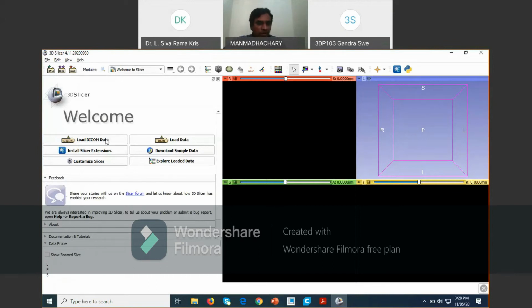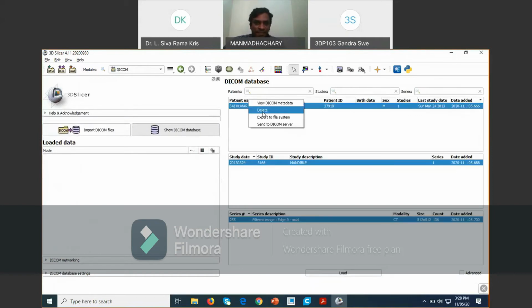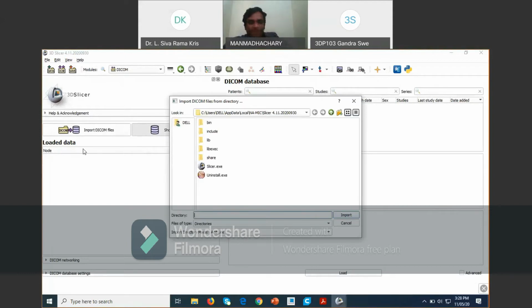First, go for load DICOM data. Are you able to do it? Now import DICOM data; just click on import DICOM data.